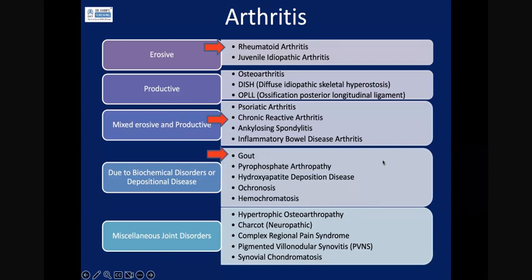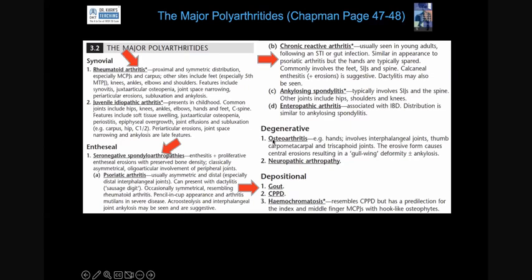Digits, and these were metatarsophalangeal joints. Was the first metatarsophalangeal joint involved or not, things like that. Out of these, I will keep 3 arthritides in the overall differential, and that should be the thought process: rheumatoid arthritis, chronic reactive arthritis, and gout. These are the 3 which one can consider, considering the findings here.